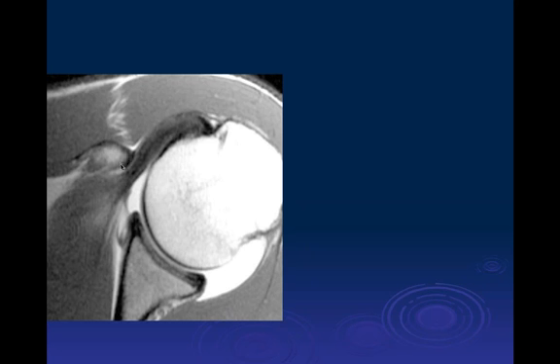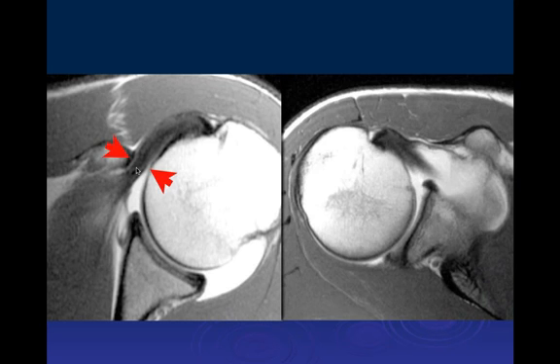One is the position of the coracoid process can produce this narrowing, and we'll talk about the position of the humeral head in just a minute. The other thing is, if you have superior migration of the humeral head, then the more inferior part of the humeral head tends to extend more anteriorly, and you have an increased risk for impingement as well if you have a rotator cuff tear. So now the other thing is that you can have a fairly narrow space here, but if you don't do a lot of physical activity, it may not be symptomatic. So just because you have a narrowed space doesn't necessarily mean that you're symptomatic.